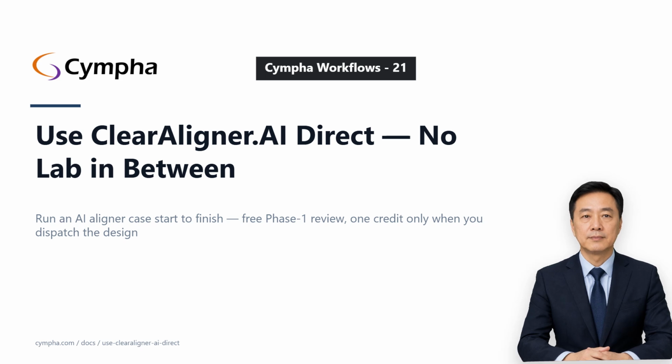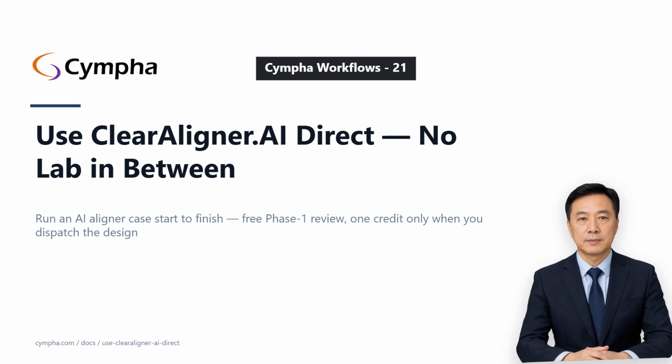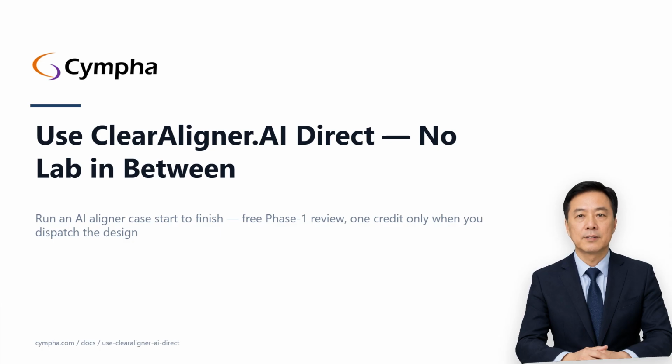Welcome to Guide Mia. Today we're going to talk about using clearaligner.ai direct: AI-designed clear aligners with no lab in between. This is for clinicians who have a Cympha account, an intraoral scan, and a credit card, and who want aligner designs without routing through a lab partner.